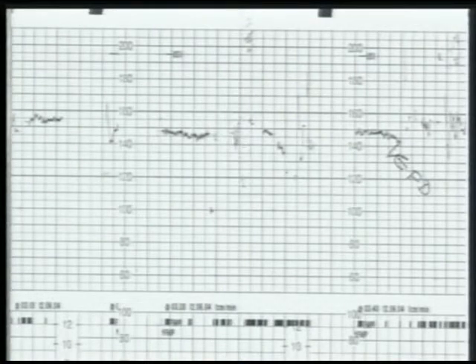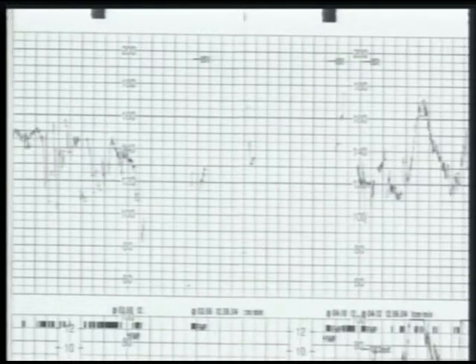It's 150. They say vaginal examination fully dilated, no contractions recorded, and suddenly the heart rate of 150 becomes 120, and once she starts pushing, with the contraction, the heart rate is going up in parallel with the contraction. So if you draw a line vertically here and another one there, heart rate is going up. Physiologically, when the head comes down and when she is pushing, there should be deceleration, not an acceleration.